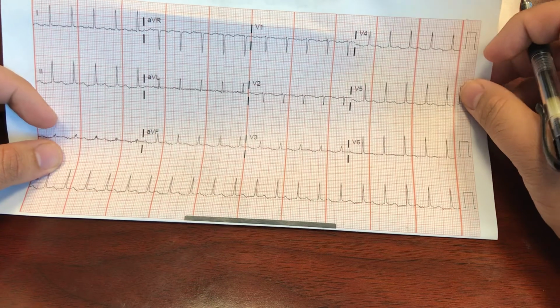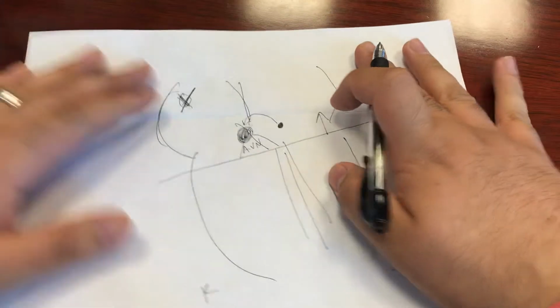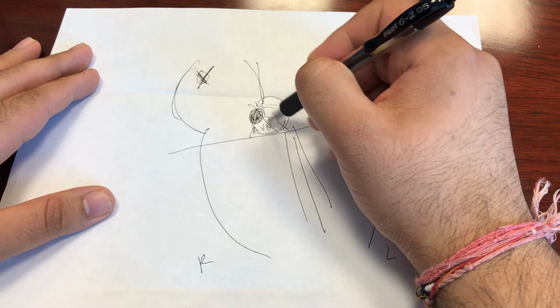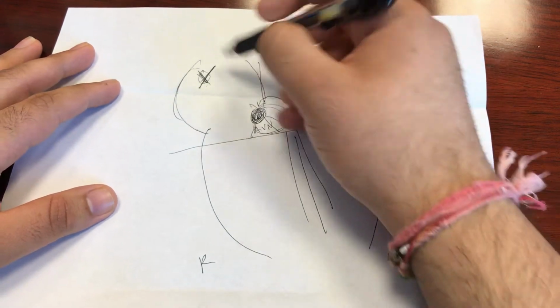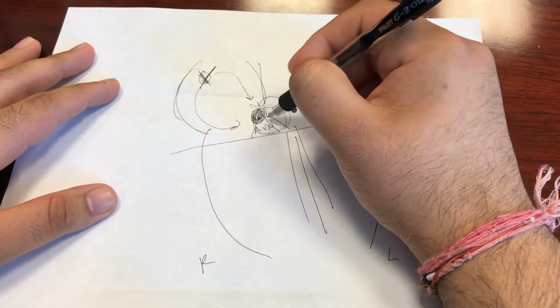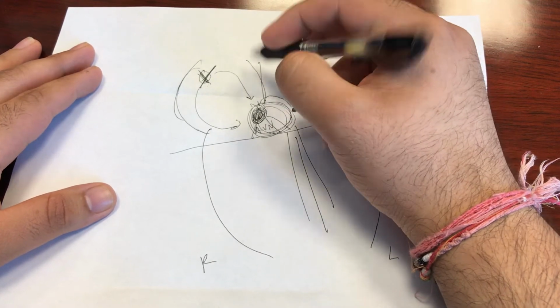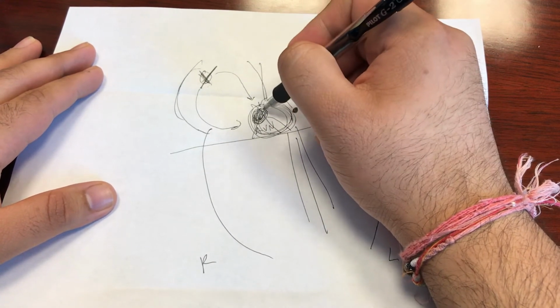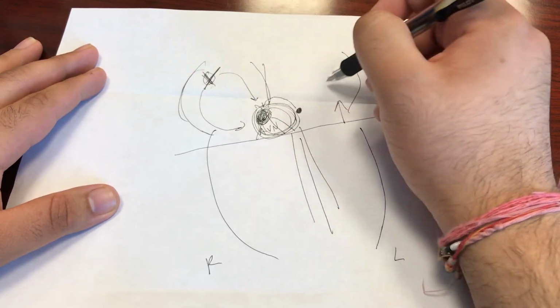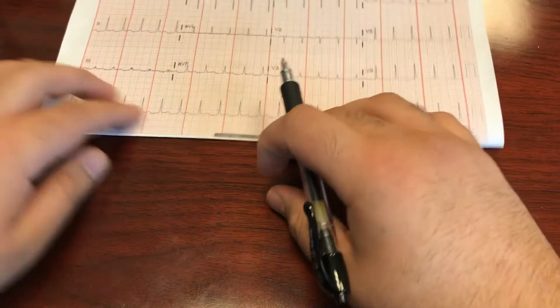Just to make a comment on some of the guesses that we got, specifically junctional tachycardia with a first-degree AV block. Remember, a first-degree AV block implies there is a block somewhere in the AV node or the His-Purkinje system. That also implies that the impulses are coming from above that AV node and then are slowed down in this system. If it was a junctional tachycardia, there's no way for it to then also be slowed down in itself. And so it is an atrial tachycardia coming from somewhere else. A junctional tachycardia with a first-degree AV block is probably unlikely.